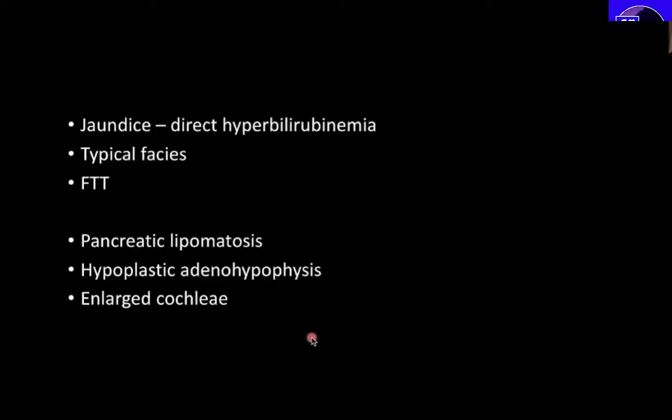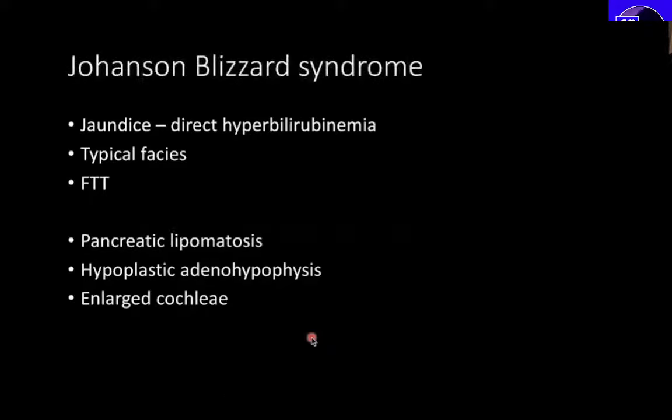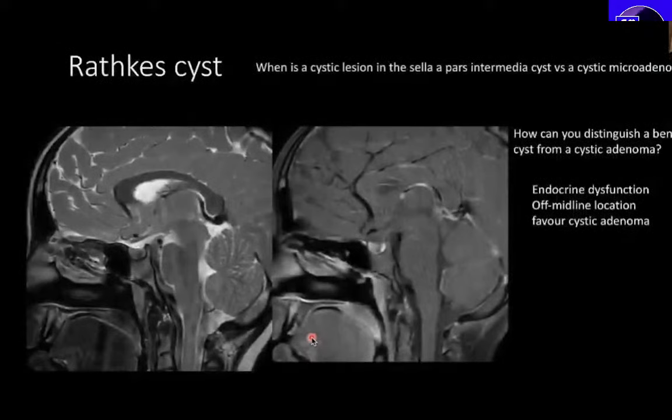So this is another esoteric syndrome, Johanson-Blizzard syndrome. No radiology presentation is complete without a couple of these esoteric syndromes. So I couldn't resist putting these cases, but they are very rare. So that's just for clinical interest. All right, coming back to the more commonly seen pathologies.